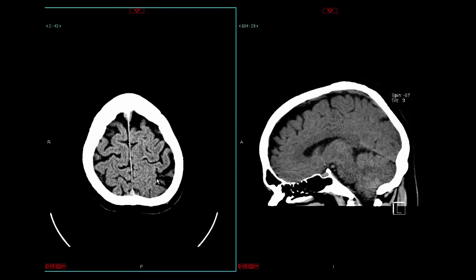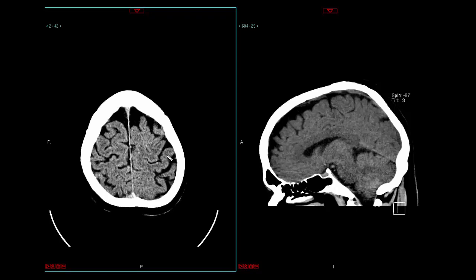Now, with this, you're going to be able to identify several other structures even on this image alone. So, again, this being the central sulcus here, you're going to start seeing the post-central sulcus, which is the first major sulcus behind the central sulcus. And on the right side, you get a better depiction of the pre-central sulcus. So again, this is the central sulcus on the right, this is the pre-central sulcus; central sulcus on the left, post-central sulcus.